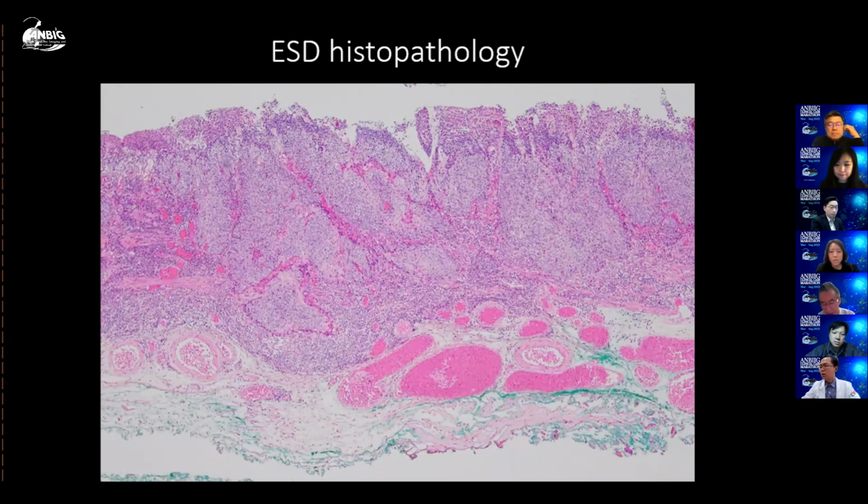But such feedback from the histological image is very important. I don't think it is a misreading, but misreading is not the issue. We always have to compare the endoscopic magnifying diagnosis with the histological image.